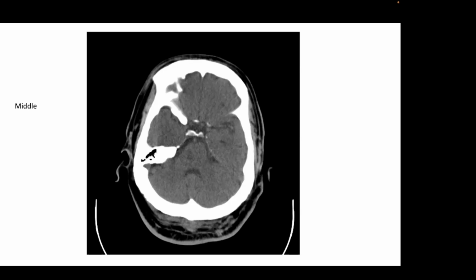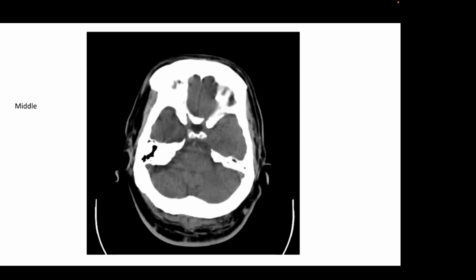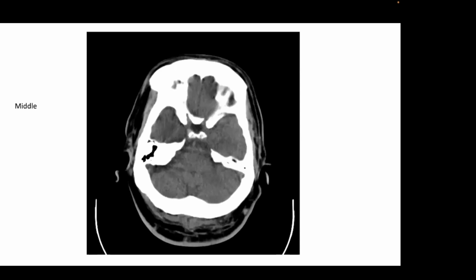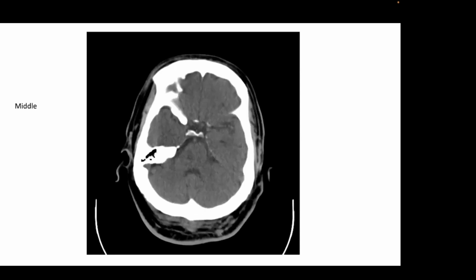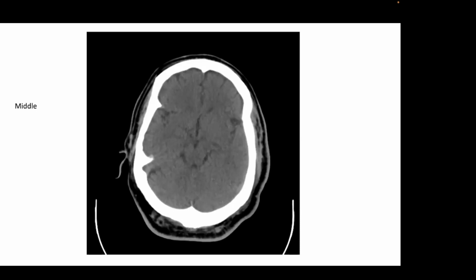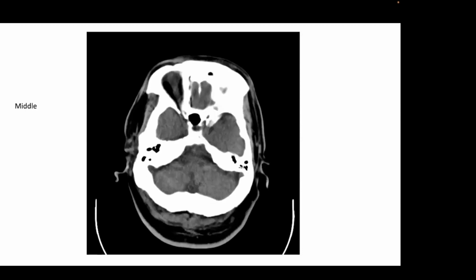I think they may not all cross at the same level, but you can be pretty sure that at the level of the pons, in this image, we can tell this is the medulla down here. This is probably medulla there. This is at the transition, but this is definitely in the pons. So in the pons, we're above the decussation. So a lesion in the right side of the pons will still give symptoms on the other side. Whereas a lesion in the lower medulla will be ipsilateral.